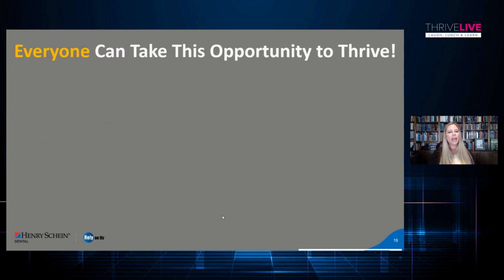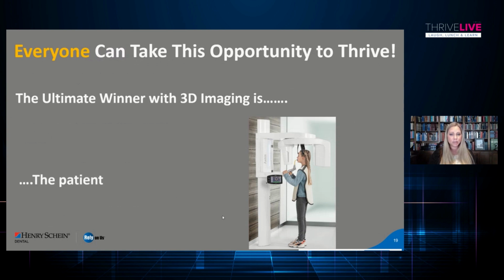And remember, everyone can take this opportunity to thrive. But who is the ultimate winner in all of 3D imaging? It's definitely the patient. Thank you so very much for sitting with me today and going through how to read a cone beam CT scan. I hope this was helpful to you. And I know I had a ton of fun. I just love getting to review everything, and you really can't have more fun than radiology. So thank you very much.